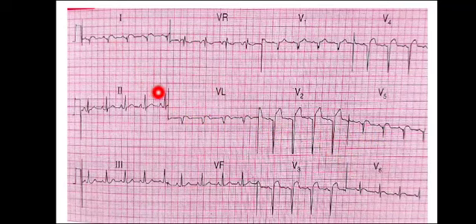But as lead 1, AVL and V5 are lateral leads, we can see that there are Q waves in these lateral leads. And then we start looking at the ST segment. Here we can see that the ST segment is also elevated in lead 1, again following the vascular pattern. If we see some change in one lead, we try to look at the changes in the other leads which are actually representing that wall.